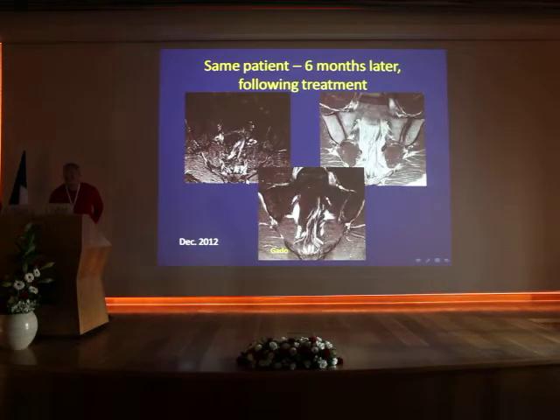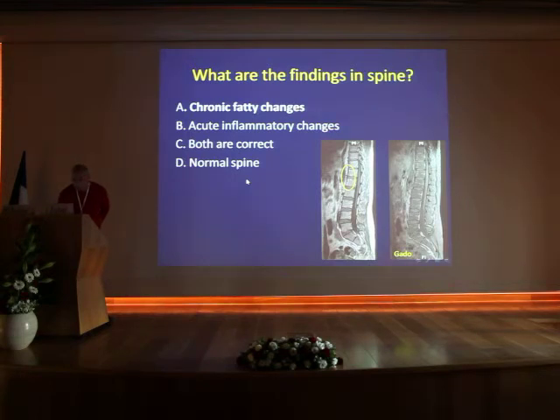Guido, can you move it? Again. There is some enthesitis at the supraspinous ligament. You can see it after gadolinium. Free fall. Sorry? Supraspinous ligament, posteriorly. That is on the right. Okay, in a small percentage. Right, you're right. So there's also active change.